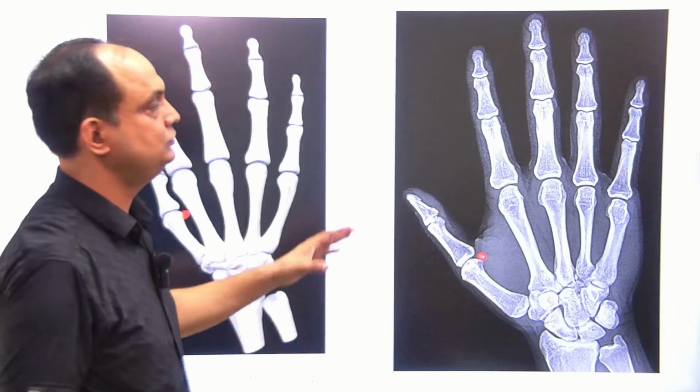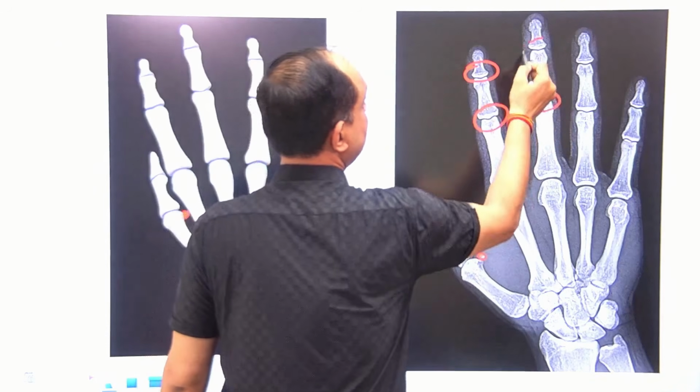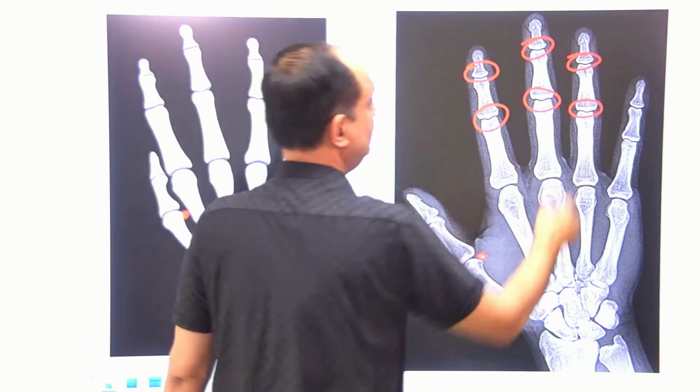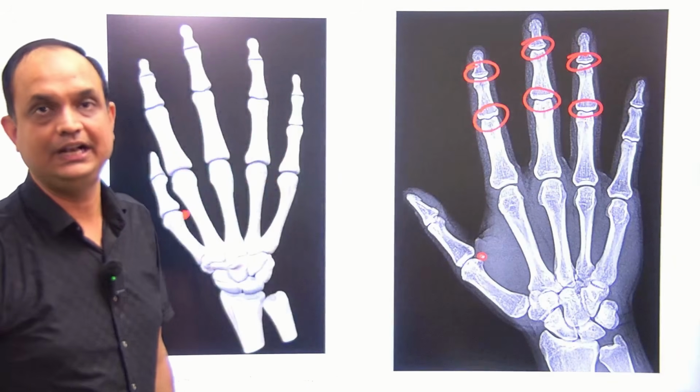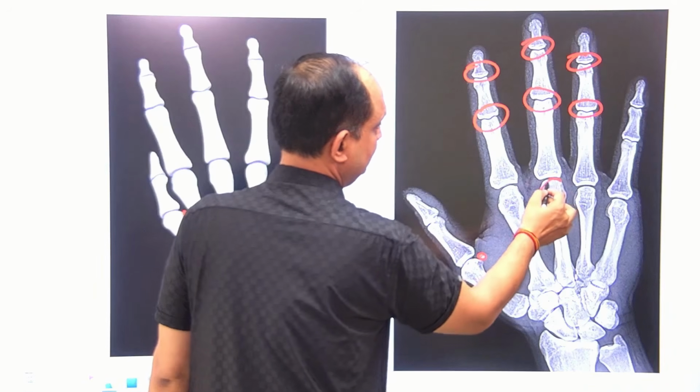Now, what questions you may have? You may have the questions that what type of joint these are. So, these are the interphalangeal joints which are classically hinge variety of joint. Clear? Now, here you will have, this is the convex and concave joint.